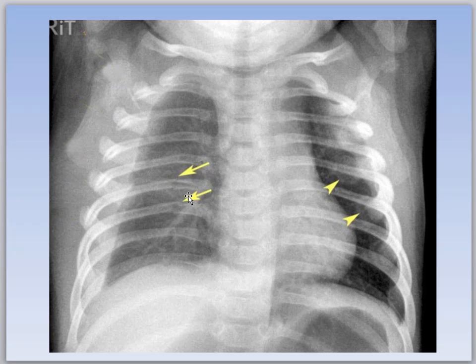Okay, let's look over the whole lung. There might be more stuff. Hint, hint. There's the arrows. So what's going on here? Look at this rib. Look at these big balls. Are those tumors? What are those things? No, those are calluses. Remember, when a bone heals, part of the healing process is callus formation. So these are older fractures. So this poor child has really been abused. He's got new fractures here. He's got old fractures here.